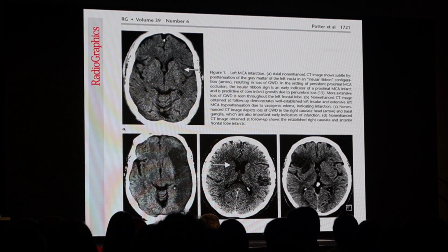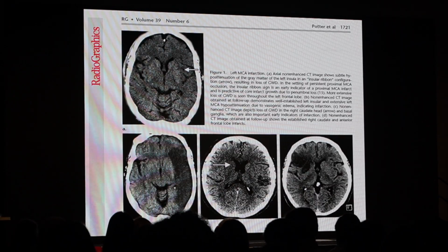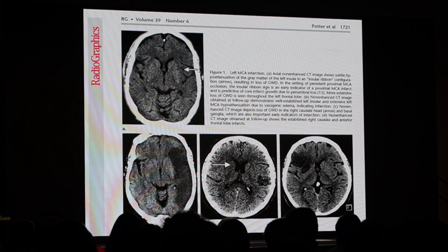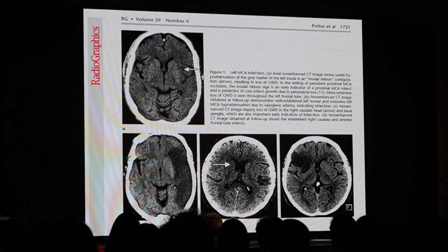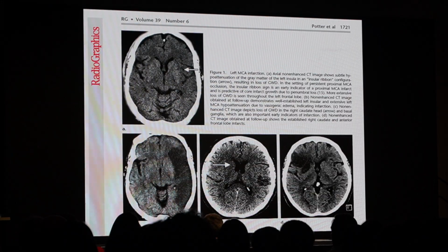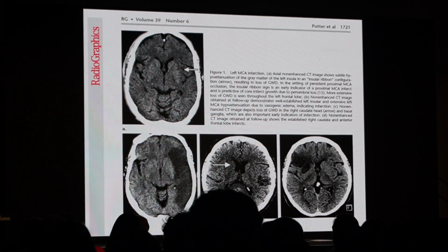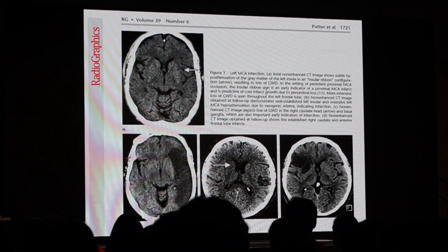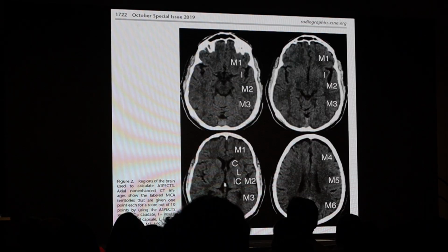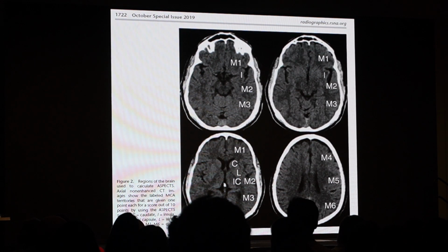Again, the theme of this talk is how important non-contrast CT is. So you're looking for subtle signs of low attenuation, subtle signs of edema. What are some of those signs? There's the insular ribbon sign. It turns out that has a lot of prognostic value. We're going to come back to that. The lentiform sign, very subtle asymmetry. We heard in the other lecture about the spine trauma. Look for symmetry, part of that ESCAPE mnemonic. Look for symmetry. That's how you're going to find these subtle things. And one thing we're going to show is that ASPECTS score, it's not worth obsessing over ASPECTS score.